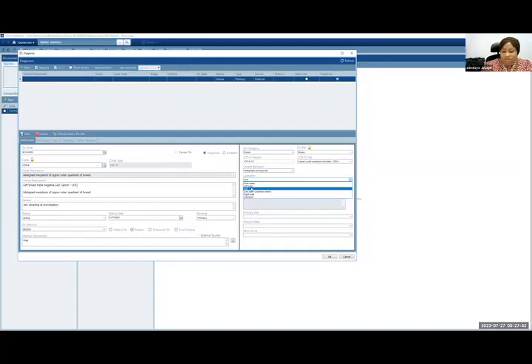For some conditions like prostate, you will be selecting not applicable because prostate is central. If it is bilateral, then you pick both sides. In this situation, we've said that this is a left breast CA, so we have to put left here. And this is all you're going to fill in on this column for a primary tumor. If the patient has metastasis, then we're going to fill in the rest, but I will come to that when I discuss metastasis. So that's diagnosis.